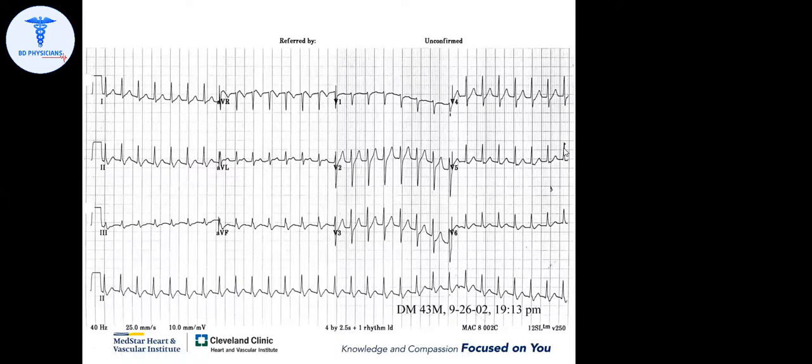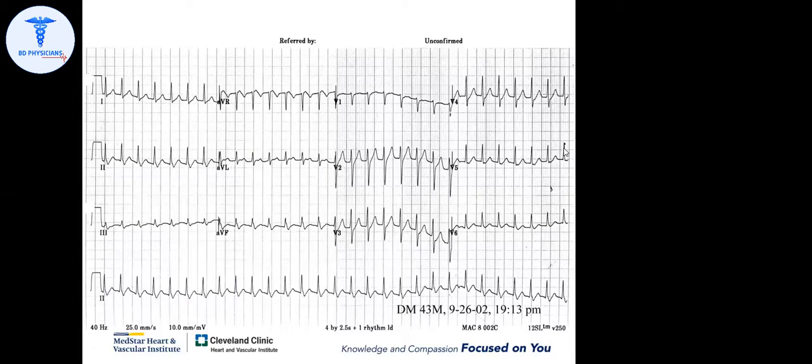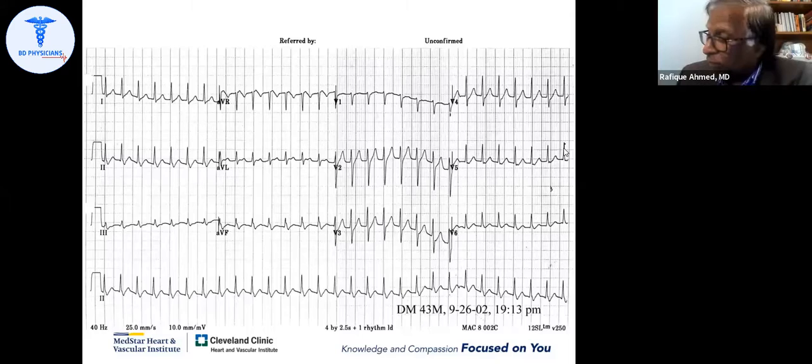Assalamualaikum, sir. Namaste. So the heart rate is a little bit over 150 beats per minute, close to 160. And you start from there. The rhythm seems to be regular. But I can't see any definite P waves in front of the QRS complexes. Do you see anything behind? Yes, sir. There is mild distortion in lead 2. Beautiful, so absolutely right. So you're looking at something, possibly this one, right?